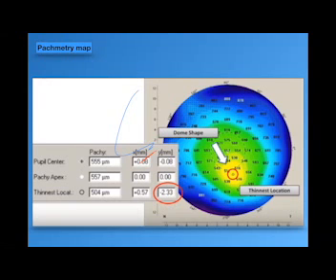If there is any abnormality in the topography, go for the deviation of the thinnest location. If you find that all of them are borderline, you have to suspect this patient, because this patient could be forme fruste keratoconus. Forme fruste keratoconus is diagnosed when you have abnormal topography with borderline maps in the pachymetry map and the elevation map.